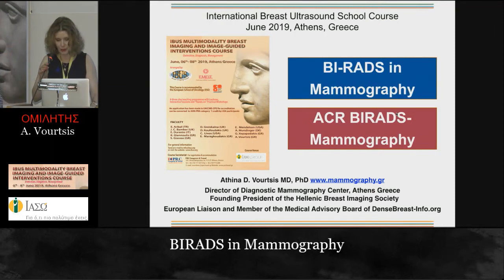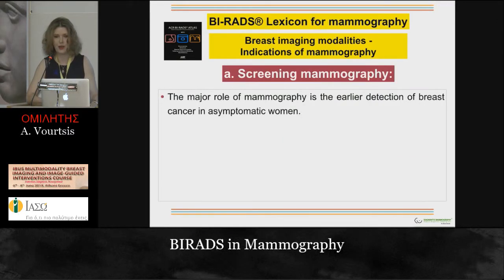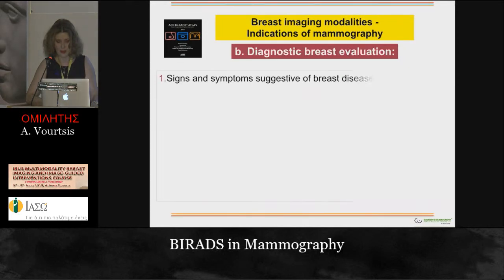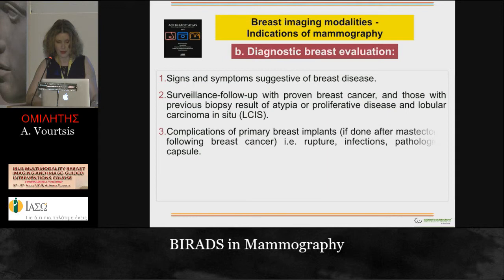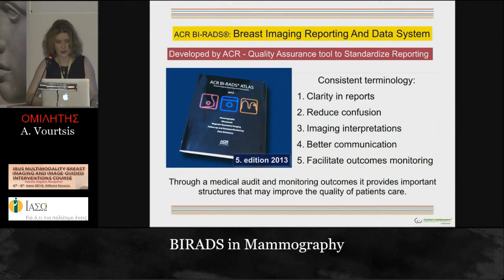So good morning, everyone. This lecture is on BI-RADS mammography, and you are all well aware of the fact that mammography is the only breast imaging modality that has shown through the years that it decreases the mortality rate. Mammography is used mainly for screening as well as for diagnostic breast imaging. All this information will be given to you, or maybe it's already given to you, in these lectures.